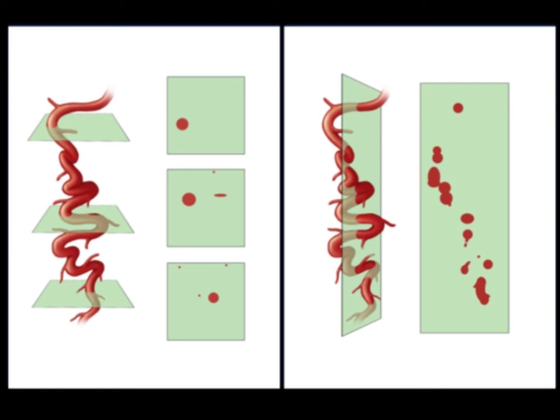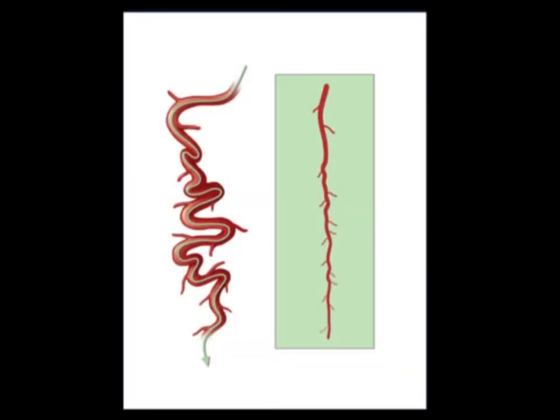And when you have something that also has a lot of big curvature, it's hard to track, and there are lots of errors when you're doing post-processing. What you want to do is put a line through the vessel and have the line come out the other side and then stretch it like a piece of spaghetti. And that's what curved planar does. So now instead of a very tortuous vessel, you have a very nice stretched vessel.